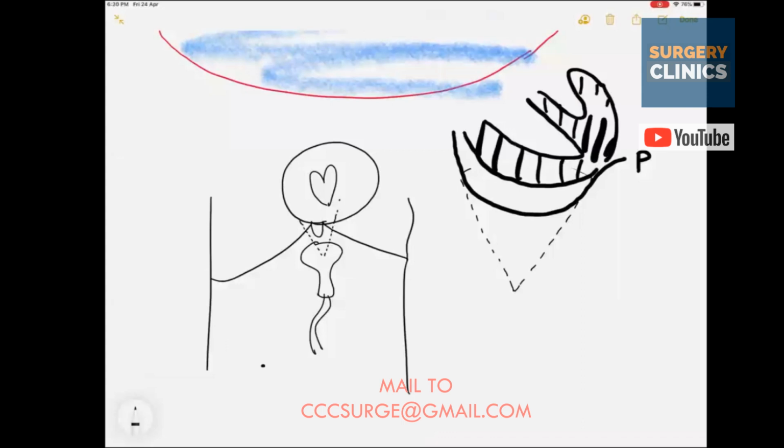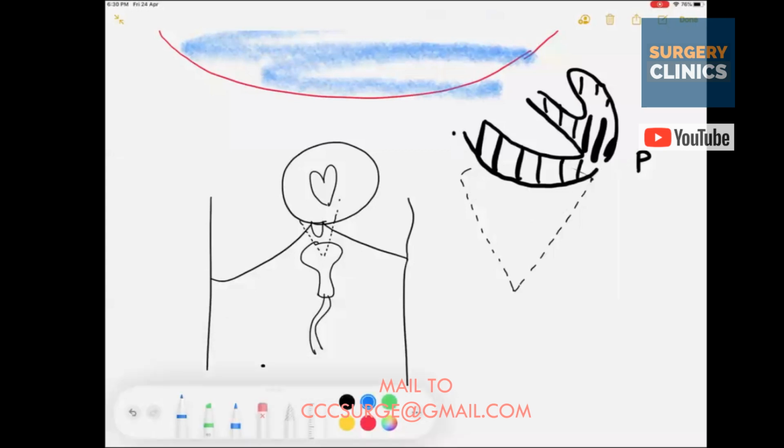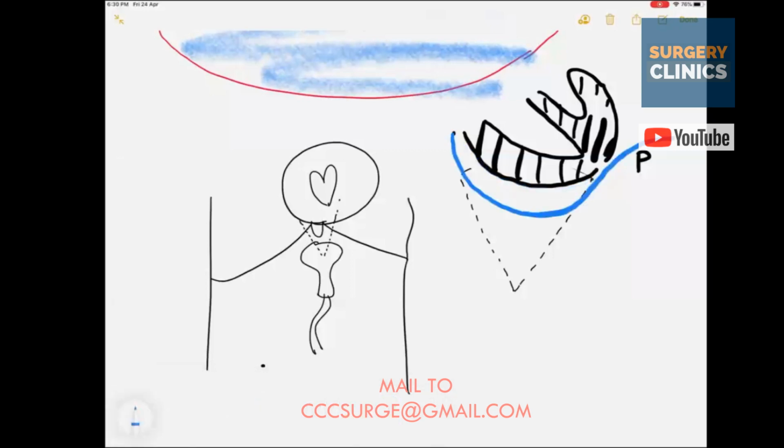And normally the pericardium and the heart are always stuck up like this. But if there is something in between the heart and the pericardium, the pericardium is going to get displaced like this, and you are going to see some little amount of blood in that. So that will suggest that you have blood in the pericardium.